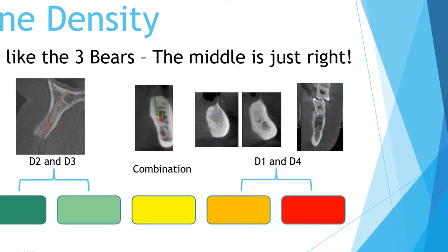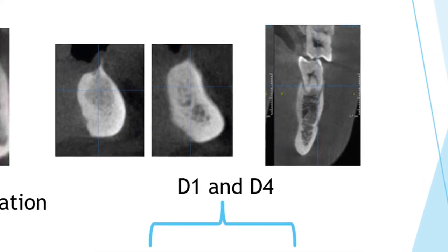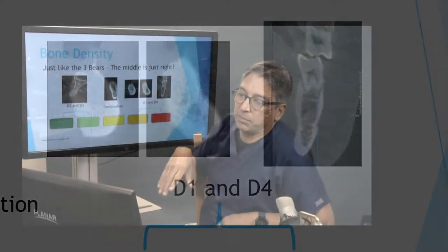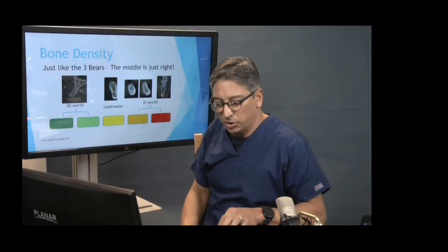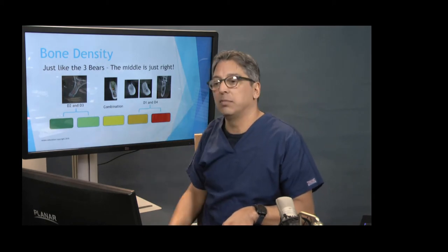This one actually doesn't look too bad, but this bone, if you were to work with it, you'd find out that there's not a lot there to hold the implant. You're really judging the side walls. Not that you wouldn't try to put an implant in there, but it would lessen the outcome long term.